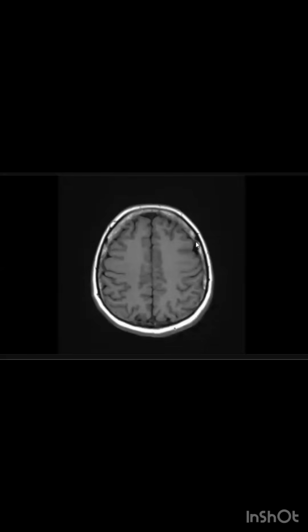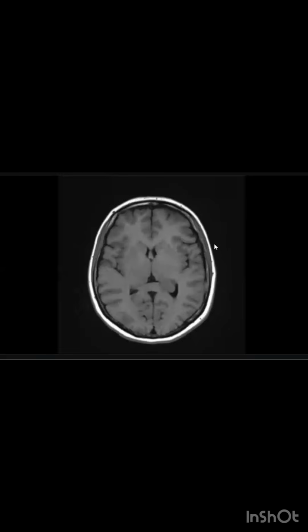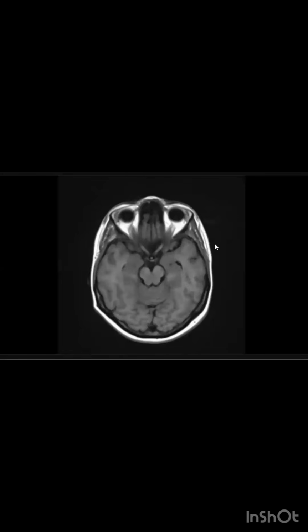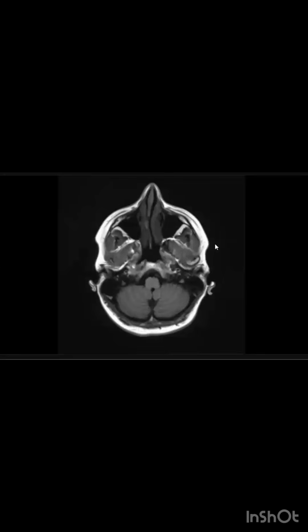Okay, your first case, a 40-year-old female patient with headache. So I'm presented with an MRI T1 for a 40-year-old patient presenting with headache. Click once and scroll by your trackball. I'm trying. I will scroll through the images.